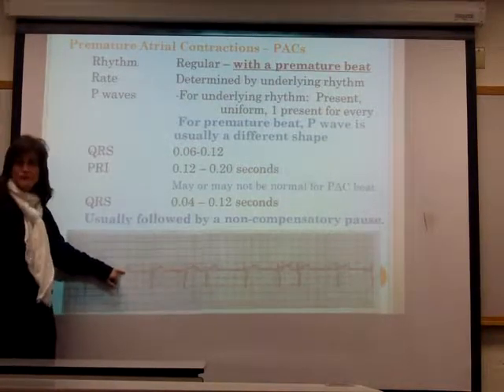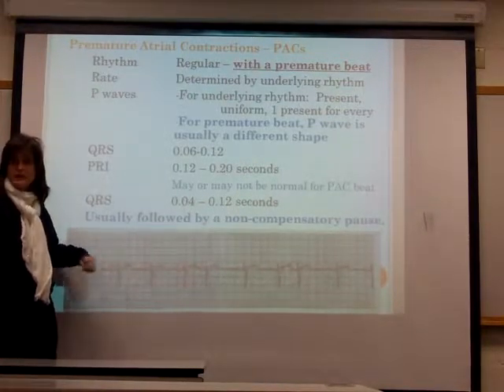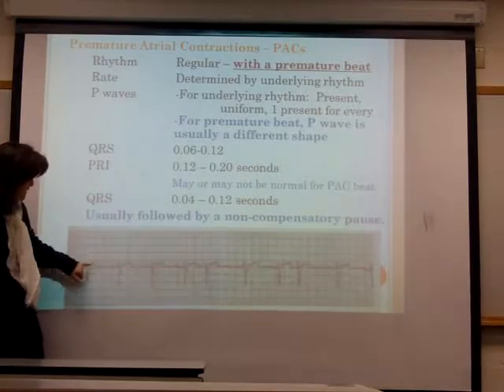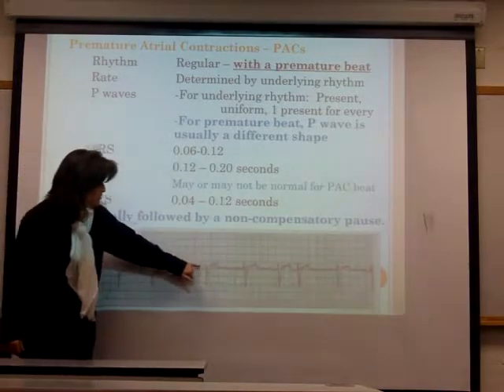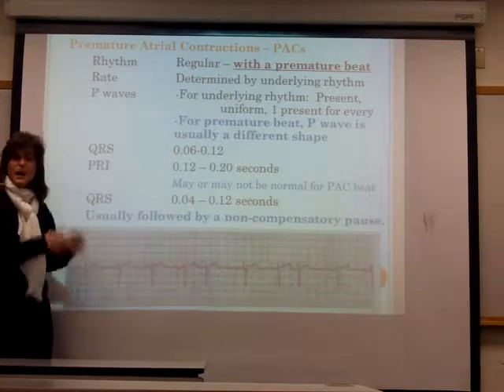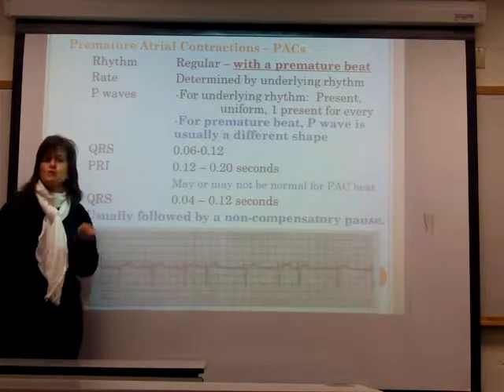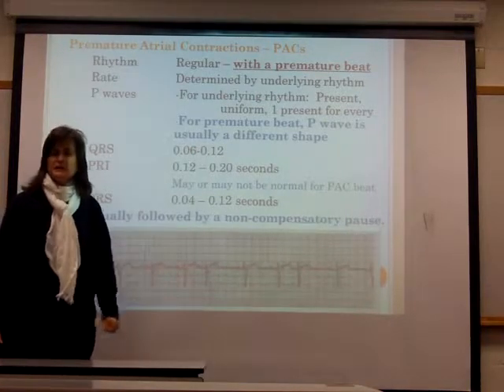I do want to make a note that I have about a 2 millimeter, you might want to call that a 3 millimeter ST segment elevation. Then I look at my T wave, very normal, not peaked, and it's upright. So far, I'm very comfortable saying the underlying rhythm for this strip is normal sinus rhythm with ST segment elevation.